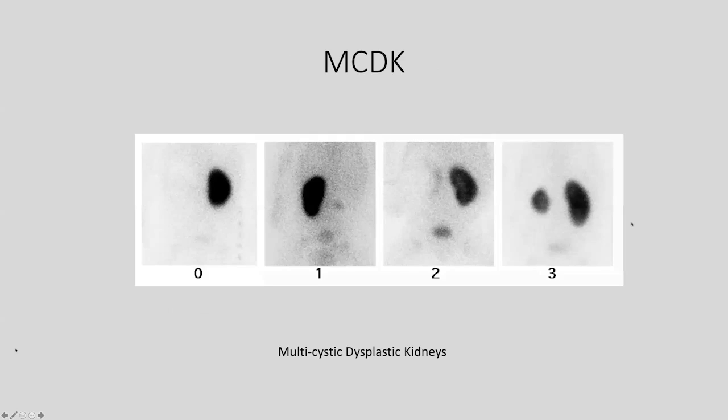In the cases of multicystic dysplastic kidneys, these are four examples of cases where the patients have multicystic dysplastic kidney.